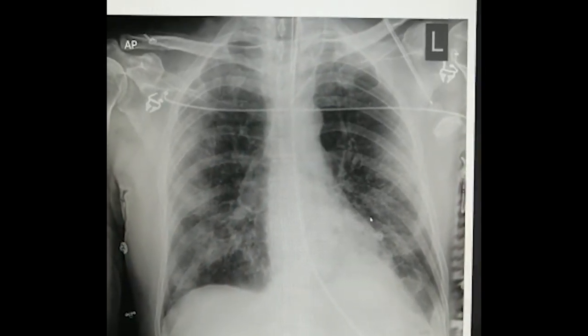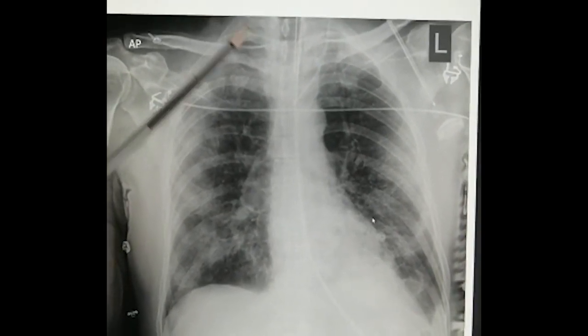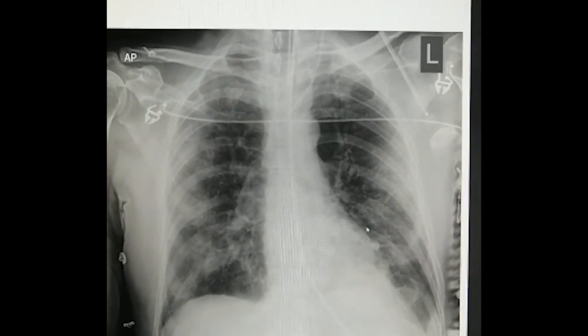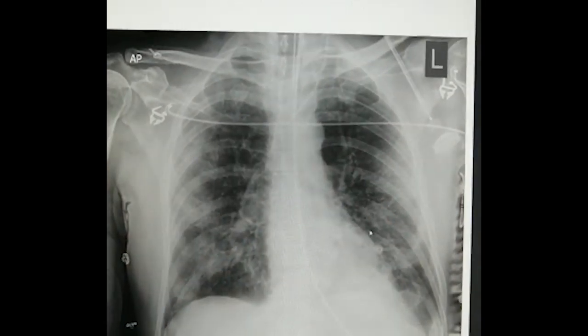And a lot of the x-rays will be to check ET tube positions. ET tubes can be difficult to find, but we've got an ET tube here, just projecting below the clavicles. Sometimes we're putting subclavian lines in, and these are more visible under the clavicles.